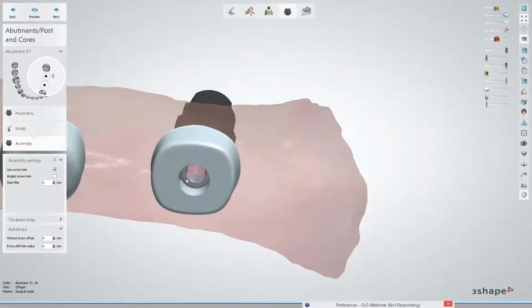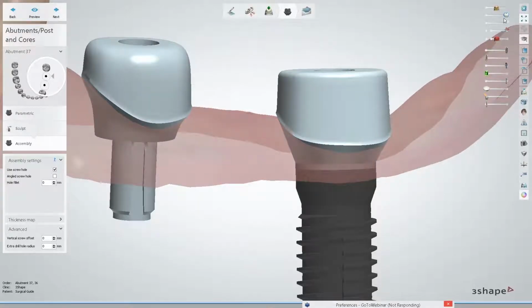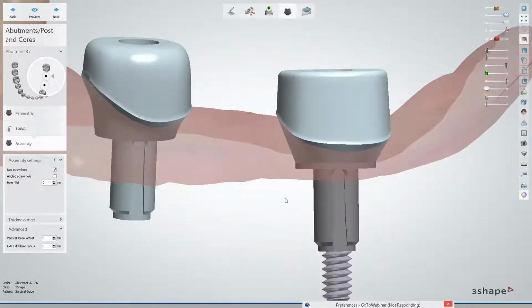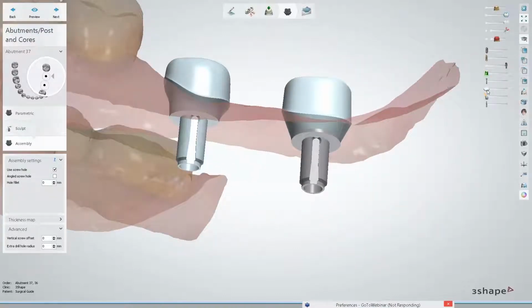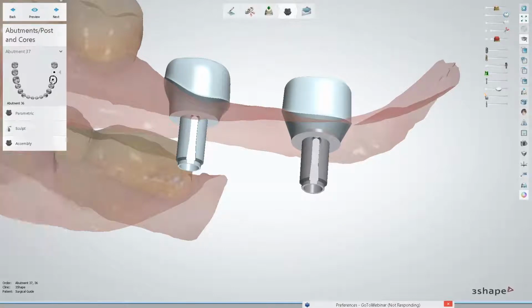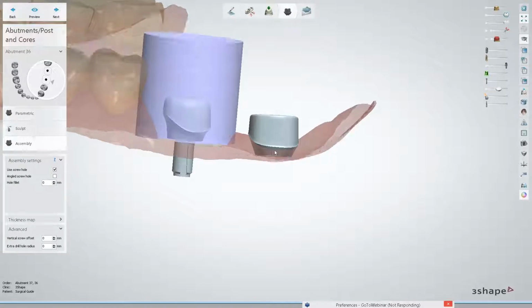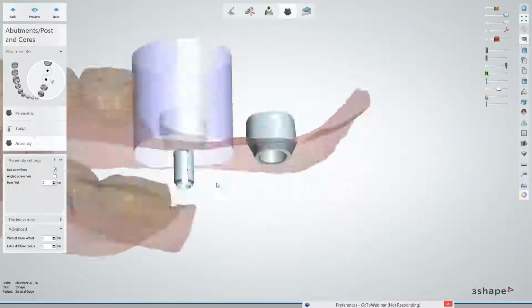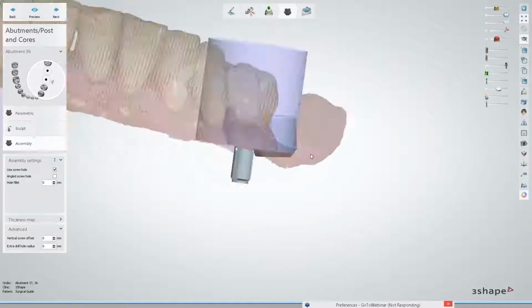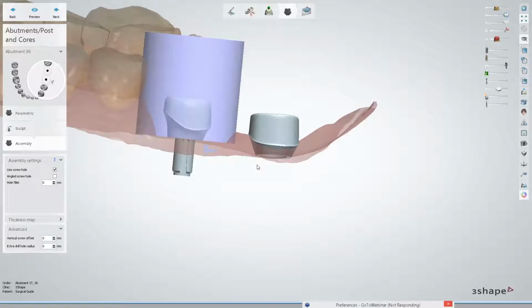And here we have another screw hole successfully generated, and of course these two files are very much different in terms of components used, so either a pre-manufactured blank for tooth 3.6 or a titanium interface for tooth 3.7, both of them possible, and as you can see, achievable in the matter of minutes.